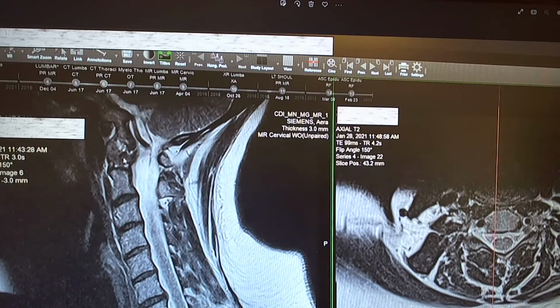Why not use only T2 images? Neil is asking, what is the point of having T1 and T2? Well, T1 images, we call them anatomical views and anatomical pictures, and T2 we call pathological pictures. And maybe one of these days we go back and look at that.